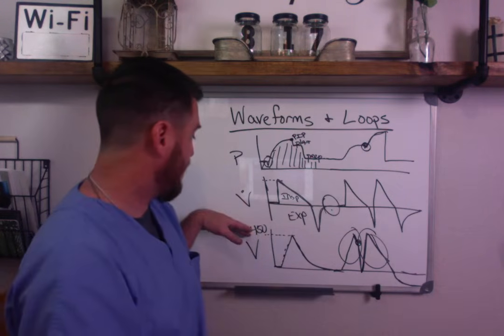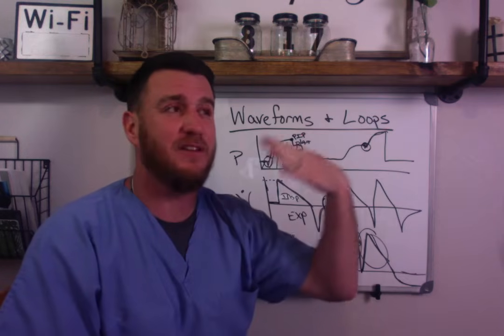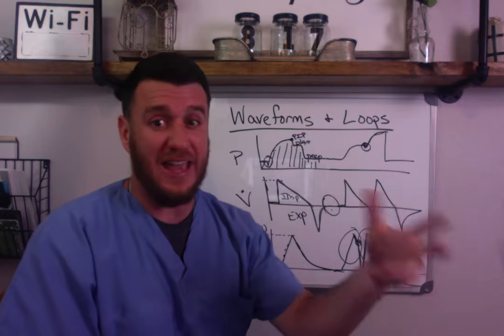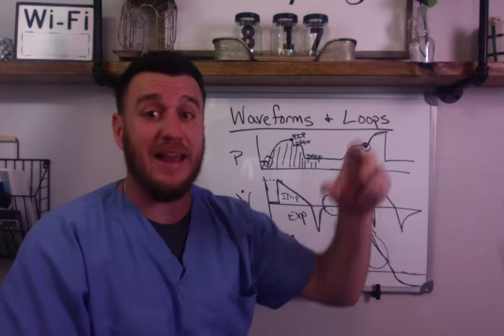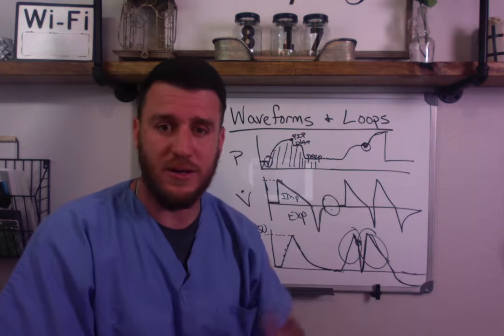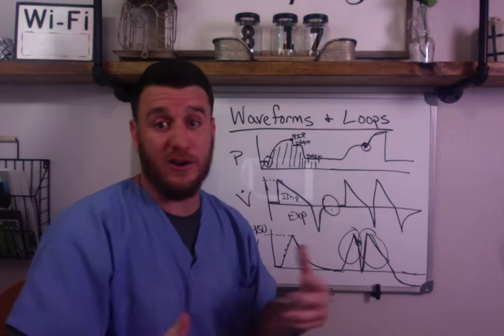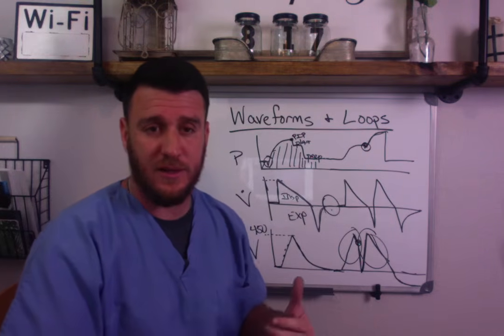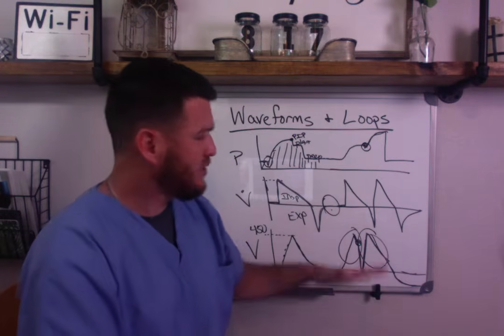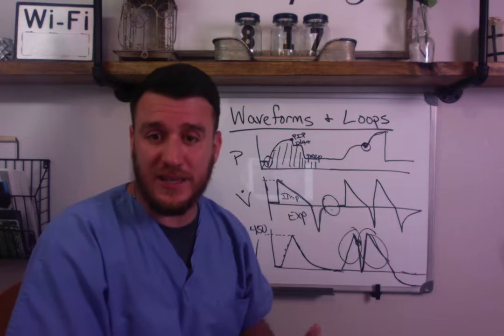What would we say? We're on 450? So if you're on 450 and you give 2 back-to-back breaths, you've basically given the patient a 900 ml breath. You didn't give it. They asked for another one, and they got 900 mLs. That's a problem. You don't want that. We went to low volume ventilation, or what I would argue is normal volume ventilation, to get away from the barotrauma associated with large tidal volumes. So if you have a patient breath stacking, you have got to get that fixed.